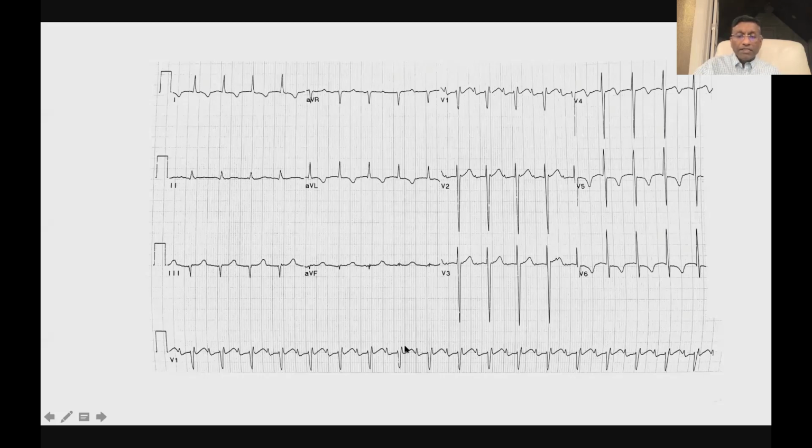That's 200 milliseconds. Another big box, another 5 millimeters, would be 400 milliseconds, and this is somewhere in between. So maybe even coming up close to 300 milliseconds, 280, something like that. So just under 300 milliseconds from P wave to P wave. We would call this an atrial tachycardia or atrial flutter. I'd give you full marks for either, atrial tachycardia or atrial flutter with 2-to-1 conduction and left ventricular hypertrophy with secondary STT wave changes.